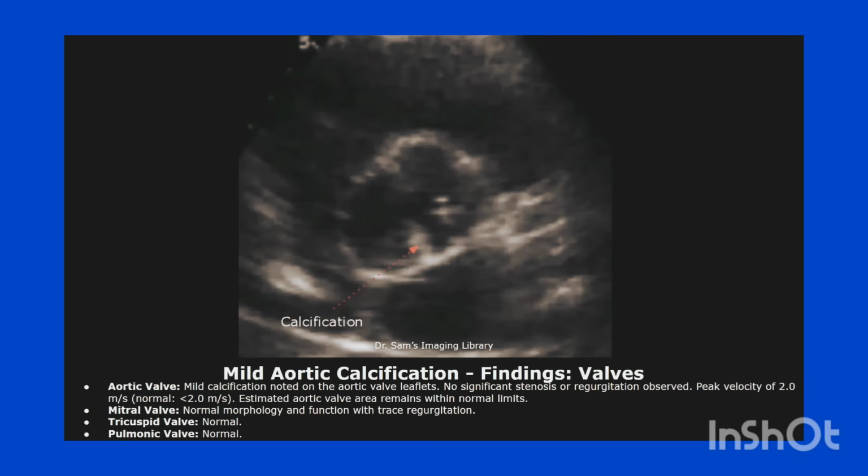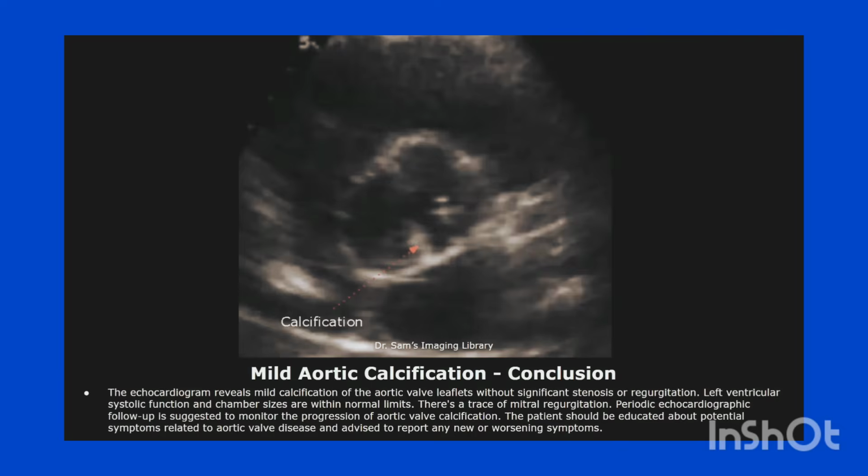The mitral valve has trace regurgitation. The tricuspid and pulmonic valves are normal. Here is the conclusion. The echocardiogram reveals mild calcification of the aortic valve leaflets without significant stenosis or regurgitation. Left ventricular systolic function and chamber sizes are within normal limits. There is a trace of mitral regurgitation.